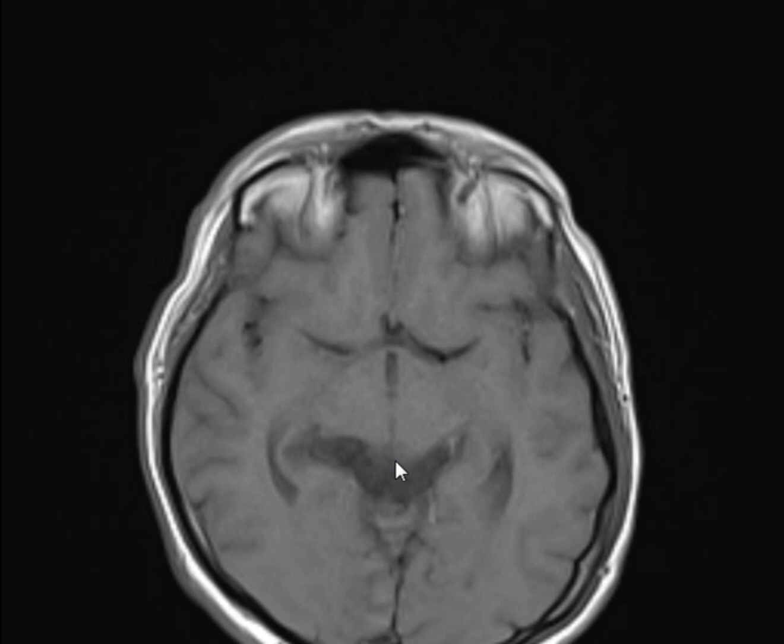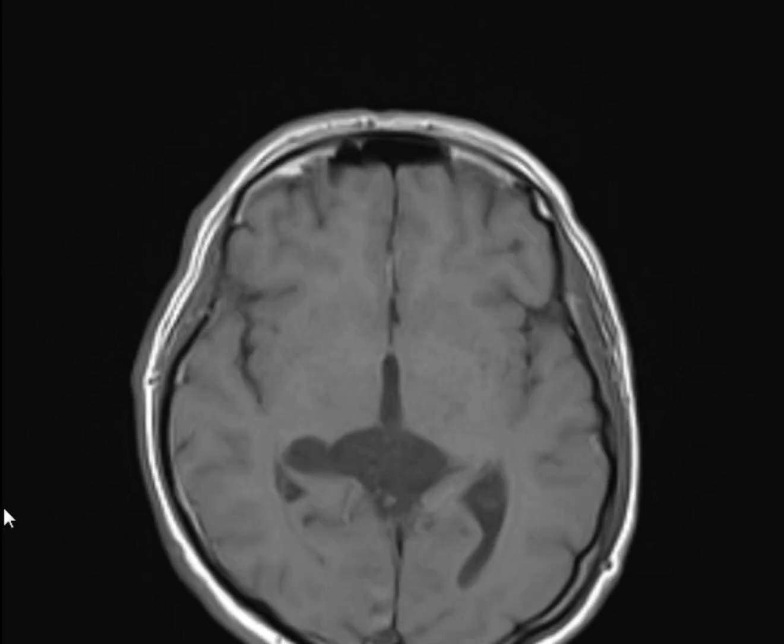So what would you like to do? Let's say, what's your differential diagnosis other than arachnoid? Epidermoid cyst. Epidermoid is a possibility. What else? Porencephaly. Porencephaly should be something congenital. Okay, I will accept it. What else? What about hydatid? Yes, also possible. What about cystic metastasis? Yes. You have to mention all of these.